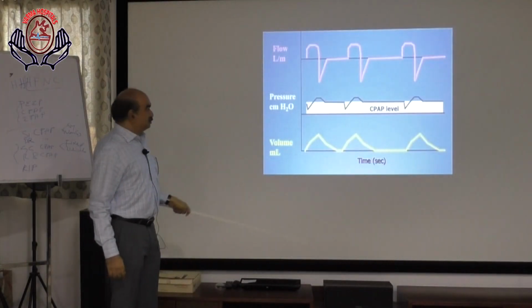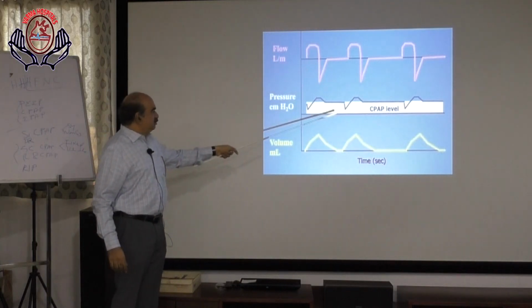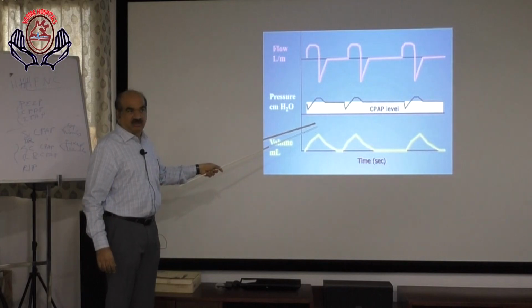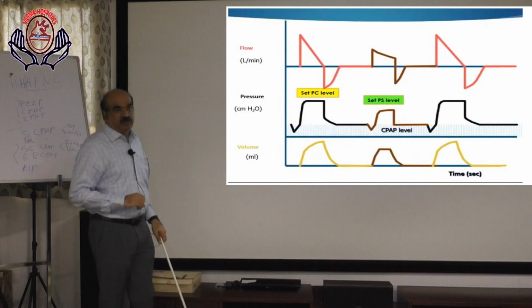What does it indicate? Again, the flow pattern is a sine wave pattern, but there is CPAP. The baseline pressure is at this point. So it is simple CPAP. Simple CPAP mode.